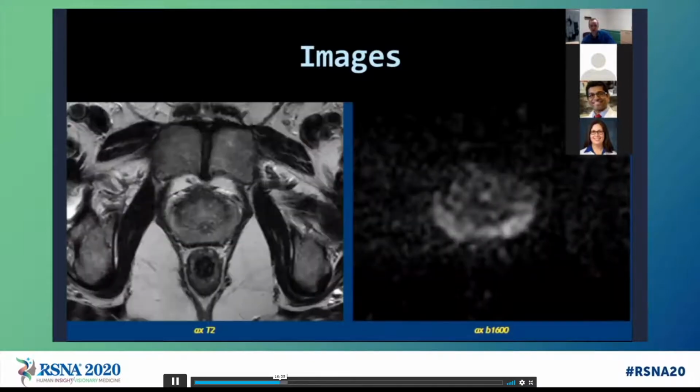The other thing, I guess we see this increasingly: this is quite a young patient, a 52-year-old. And yes, they can have prostatitis. I see this quite a lot. We almost describe it colloquially here as being a dirty peripheral zone that you see in these younger patients.